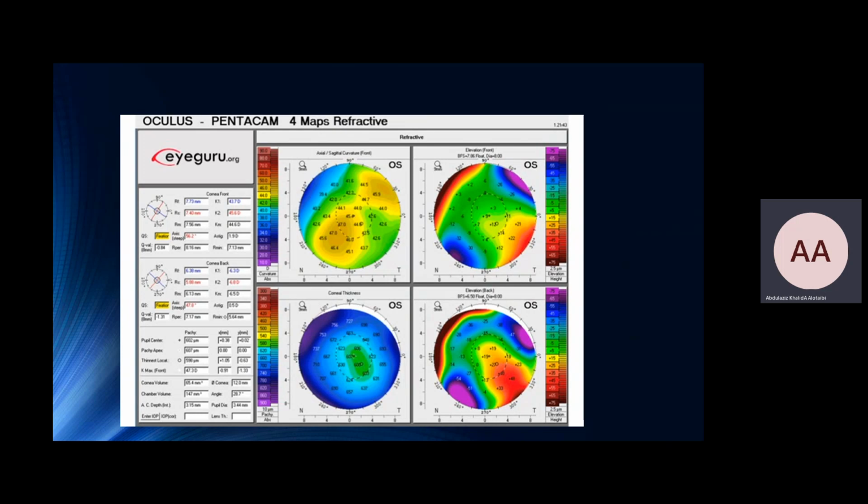Who can take this question? Same topography. R3 or R4. Suppose this patient came with cataract. He's for cataract surgery, and he has 2 or 2.5 corneal astigmatism. Do you think this patient is a toric IOL candidate, and why?